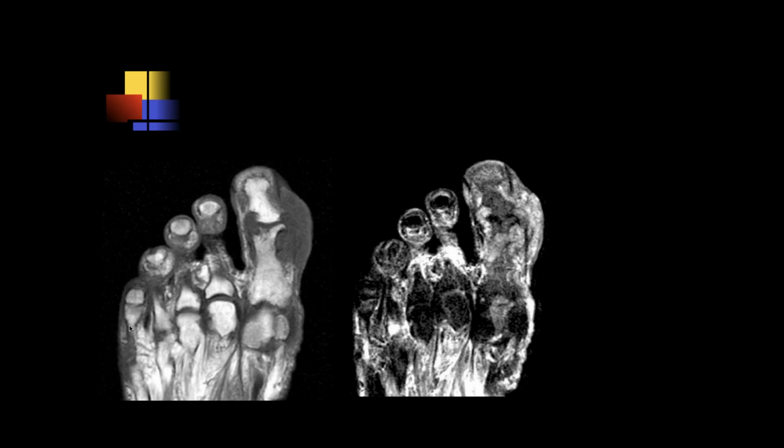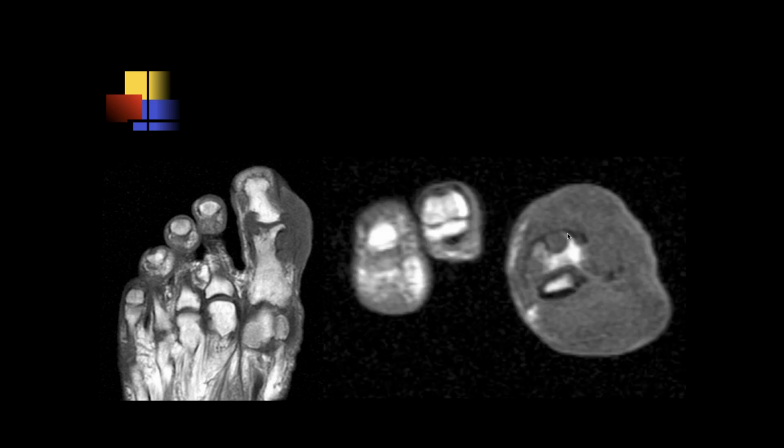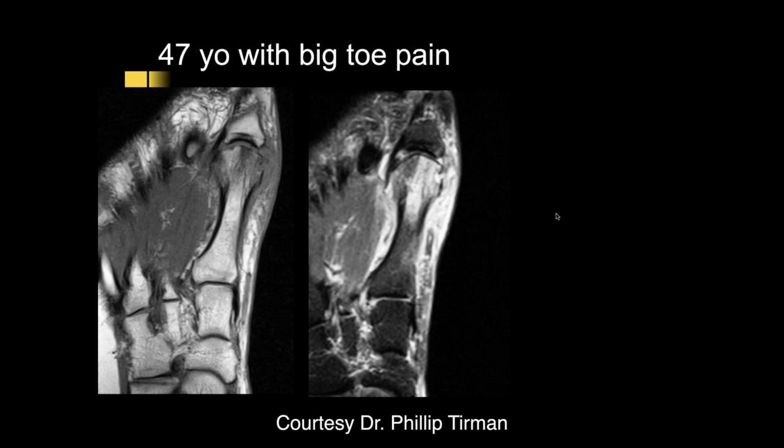Michael. Okay, so in that first digit IP joint, we see significant marginal erosions along the joint with significant synovial pannus extending into it. So it's kind of similar to Jennifer's case, that this could be gout. Again, you see these sharp little spicules here. And notice how sharply defined this is, with these sharp little spicules that aren't flattened out. Yeah. And again, that's characteristic of gout. Classic, isn't it? Yeah, the great toe. Right, and the great toe is the classic place, absolutely. Ashu.